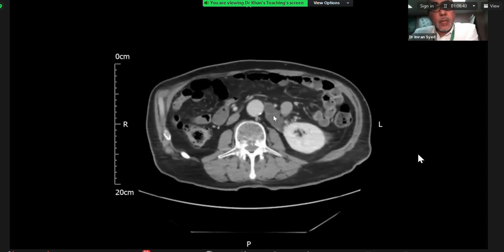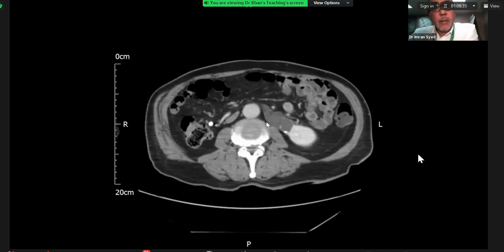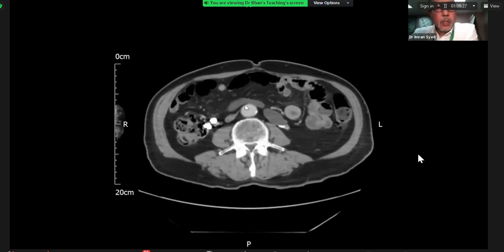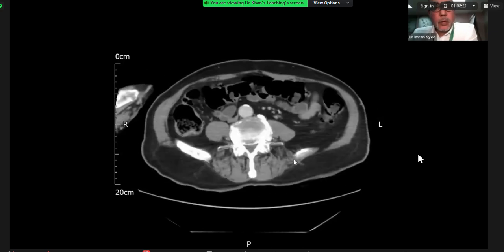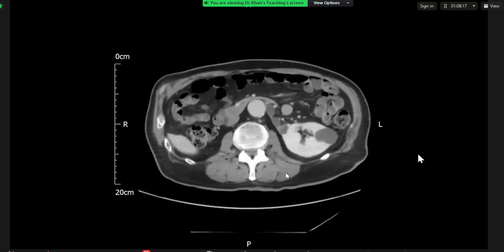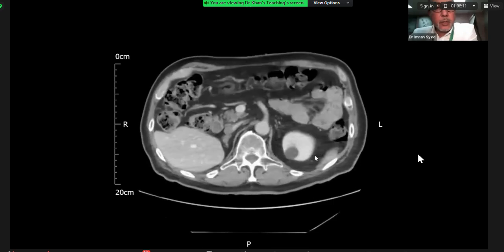kidney. And that appearance there is largely cystic. You see a high attenuation area posteriorly, which could be a stone. And then that's contiguous with this tubular structure, which crosses the midline and comes further south. So what's going through your mind at the moment? Cross-fused ectopia. Yeah, so cross-fused renal ectopia with a normal appearance to the left kidney, i.e. the contralateral kidney is normal.